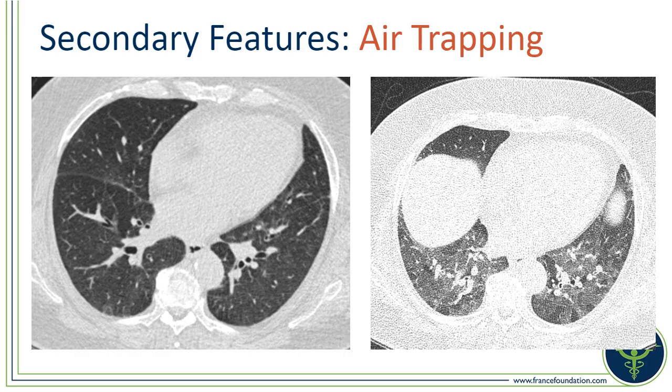If they are, then it's either small airways disease or pulmonary artery hypertension. If they are the same size as the whiter areas, then the white area is the sick area, and it's probably some ground glass, maybe inflammatory or infectious. So the blood vessels in this patient are smaller in the dark area. So an expiratory CT scan is done, and we see that there is more obvious heterogeneity of the lung parenchyma, which confirms that this is air trapping due to small airways disease.